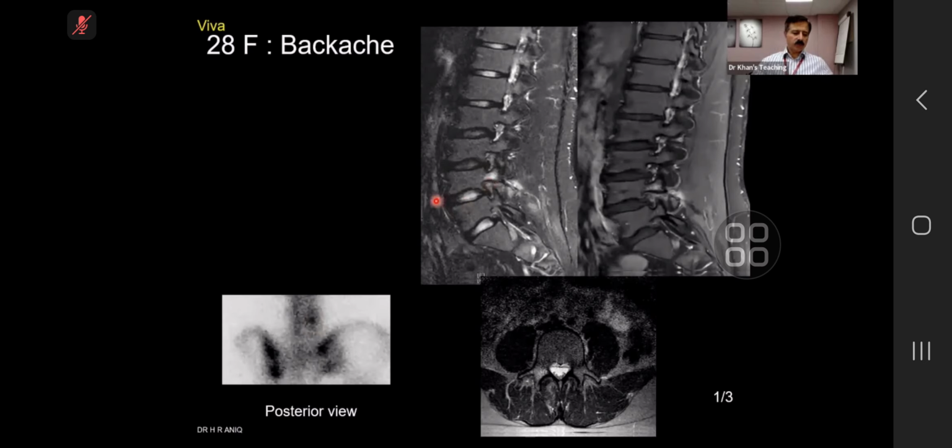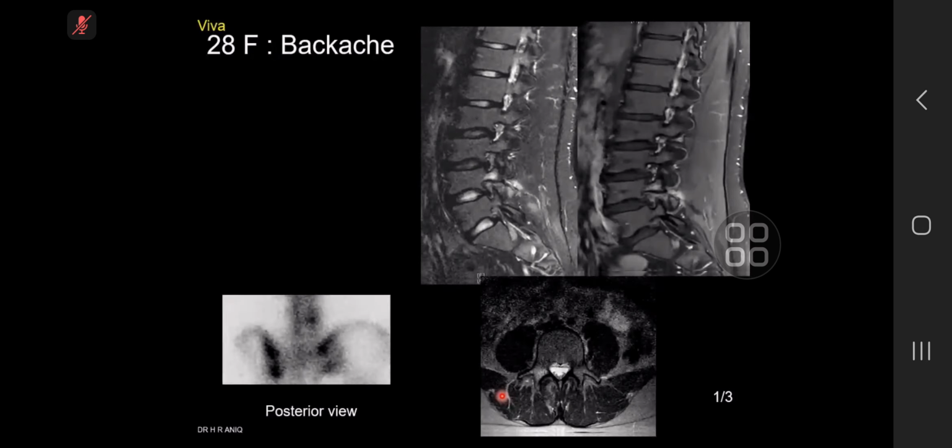Over to you. Okay, so on the selected sagittal MRI slices, there's high STIR signal in the pedicle of L4, which I think on the axial correlates to the right pedicle, sorry, and also some increased T1 signal. Also, there's selective uptake in that pedicle on the bone scan. In a patient of this age with a history of back pain, these appearances would be in keeping with an osteoid osteoma. What is your differential diagnosis?